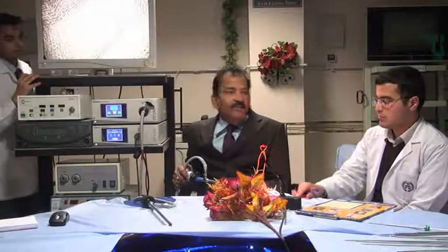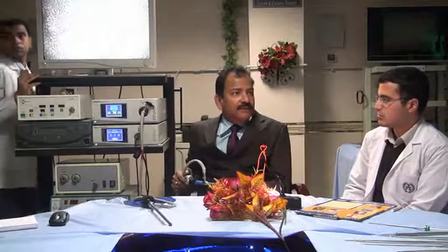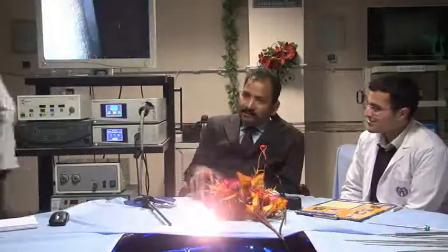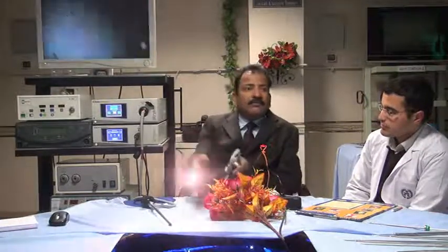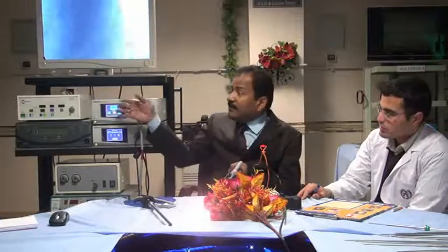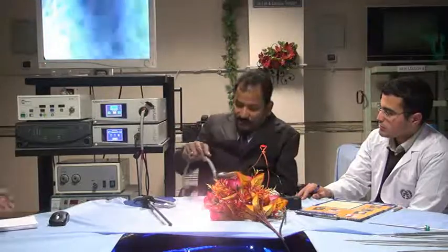There are two types of circuit. One is closed circuit, the other is open circuit. In your mobile phone also, there is one CCD, one lens, one coupler. It is also there, but all is covered by one glass. So it is not changing, the variables are not there. But here, sometimes you are applying a hysteroscope, sometimes a laparoscope, sometimes 30 degrees, sometimes 0 degree, sometimes Storz, sometimes Olympus, sometimes you are changing the light source also.